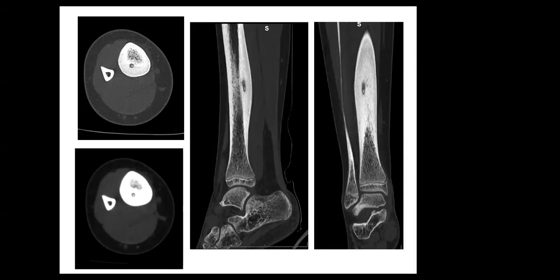in mid of tibia with the central lucent, mostly with the osteoid osteoma, and a point in the history is that in response to the non-steroidal, it's more good, and child, more good with the osteoid osteoma. The shape and size less than 2 cm are more good with osteoid osteoma, and sclerosis with nidus. I think osteoid osteoma.